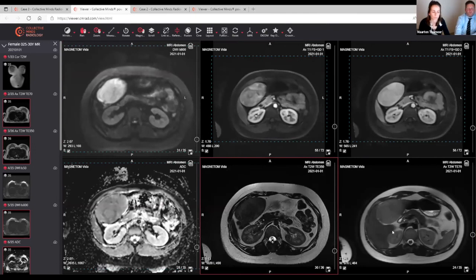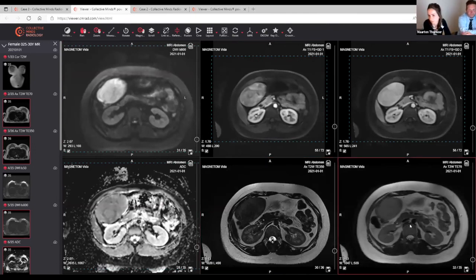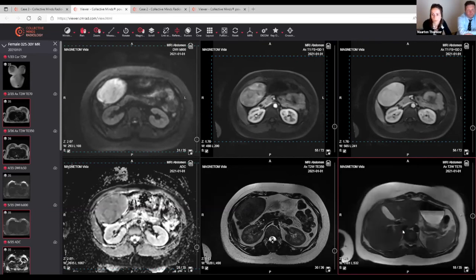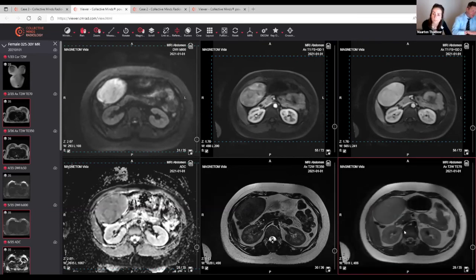So what would be your advice to the clinician? I think we need to perform a biopsy. What's the reason for the biopsy? Yeah, there's a nodule, and always when you see a nodular appearance, you better do a biopsy to be sure there's no HCC or beta-catenin adenoma. Are there other signs of malignancy? Well, it's a big lesion, so size is also a reason. We mostly always do a biopsy when it's larger than 5 centimeters, except for steatotic adenomas.